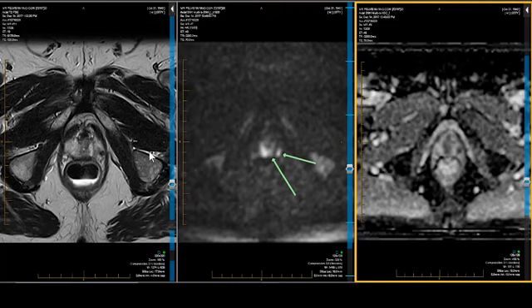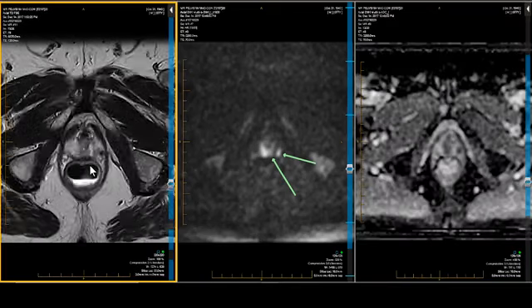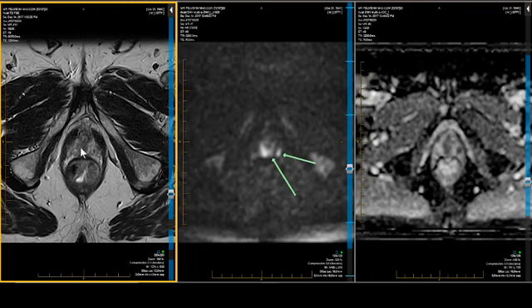So we've got in the peripheral zone major criteria for a RADS 4 lesion. In other words, focal diffusion restriction that is well defined, that is mass-like, that progressively and intensively increases in signal and is clear and sharp on the diffusion-weighted image. And it is corresponding, maybe the images are just slightly a little off, because right there, that corresponds very nicely to this locus and to this shape.